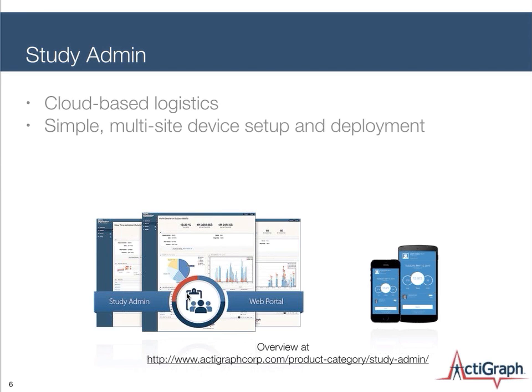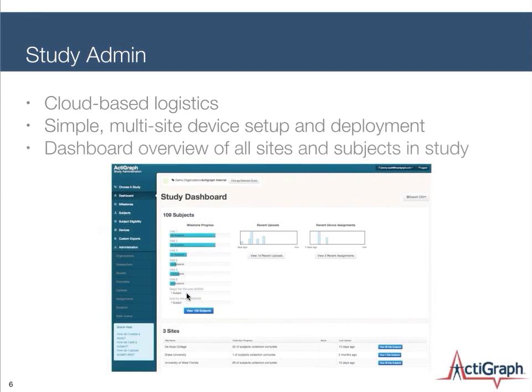You'll notice the mobile application indicated on the bottom right. I don't have a bullet for that just yet, but we also provide the option to grab data and push it into that web portal using mobile devices. That's another added benefit of this system.